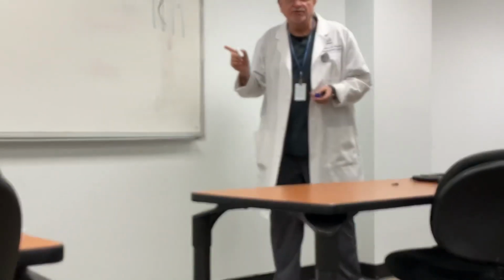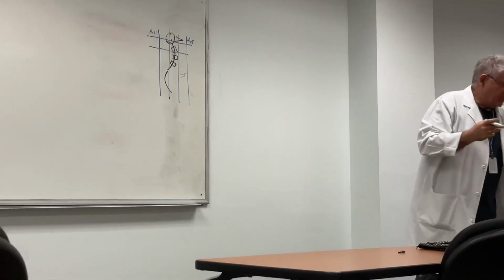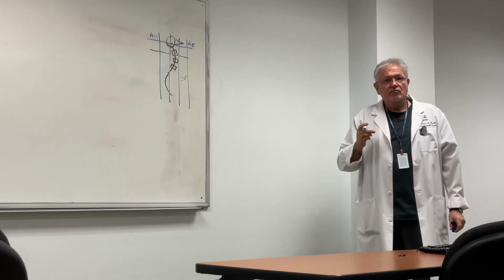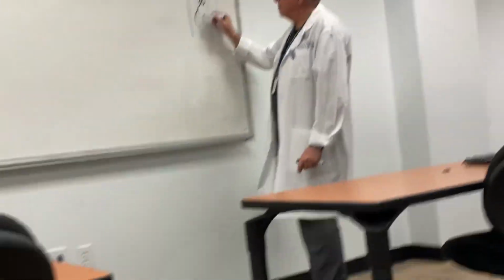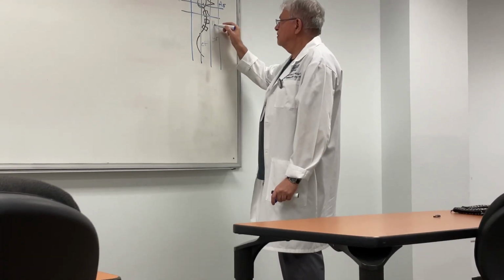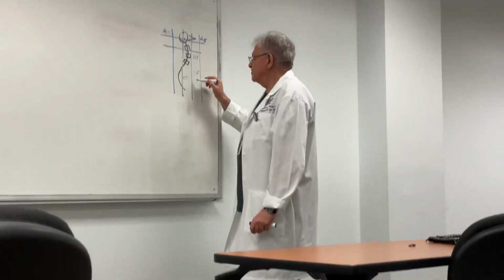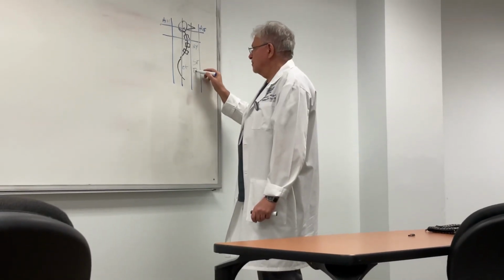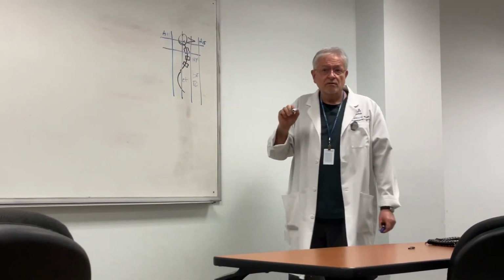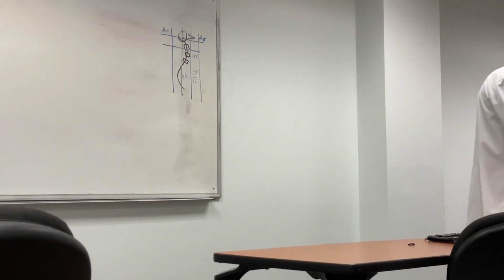What soft tissue structures, just without even thinking about it, are anterior in the cervical spine? The trachea. Trachea, good. Esophagus. HY is hyoid. Oh, sorry. Is there a trachea? I mean a thyroid? Yep. Okay. So if you see it on the film, are you responsible for it? Yep. Okay, just saying, okay?